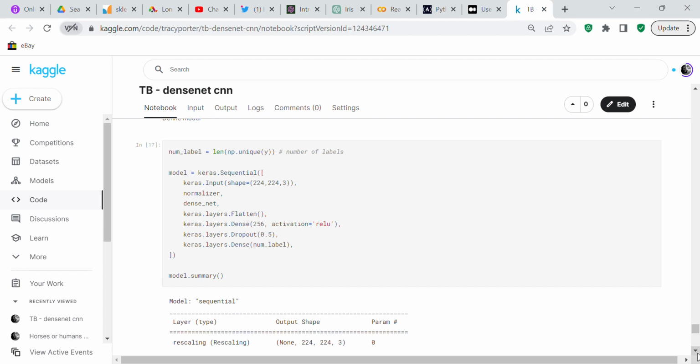So you could have just as easily said input_shape. All of these places in the program where I say 224 by 224 by 3, you could just as easily say input_shape, but you can see I've been working on it all day long trying to get it to work, so I just left it as it was. But that's something that you can do if you want to.